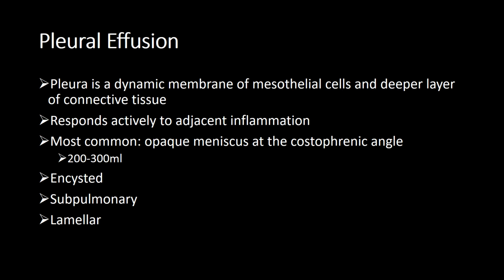Remember, a difference of more than 3 centimetres between the left inferior hemidiaphragm and the right hemidiaphragm is abnormal. So this will suggest that there's a subpulmonary effusion.